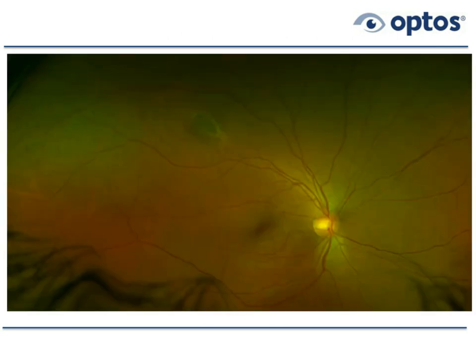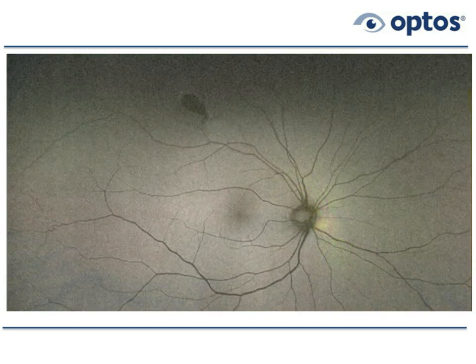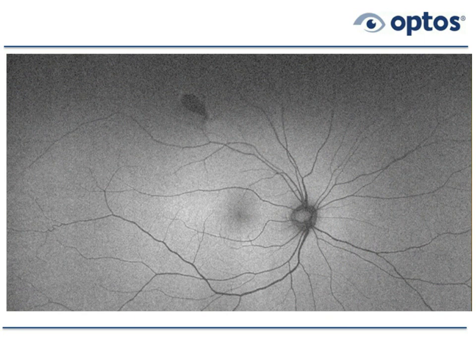Here's a CHRPE lesion from a student of mine, actually a resident. You can see it's supratemporally in the right eye, a darkish lesion. What does it look like on autofluorescence? Here's what it looks like on autofluorescence. So it's dark. We did do OCTs through this, and it's congenital hypertrophy, so the RPE is still present, but the photoreceptors above it, the PIL line, the photoreceptor integrity line, is actually missing. So that's a little bit of an exception, but it's something to keep in mind.